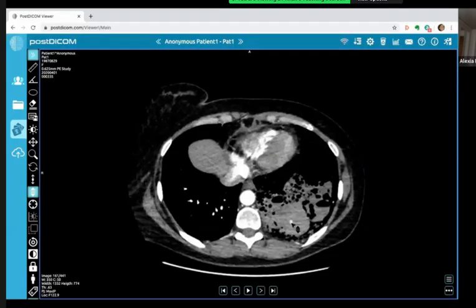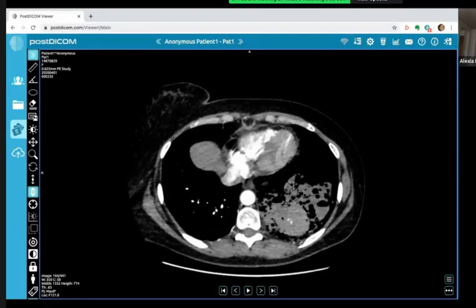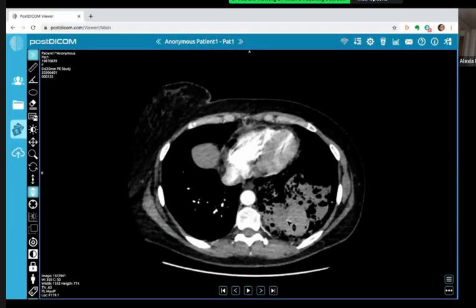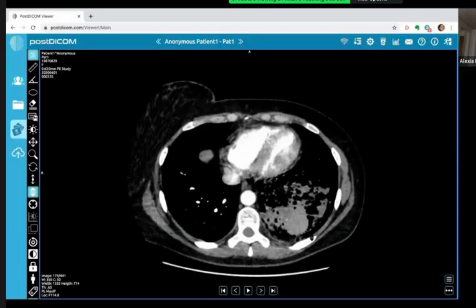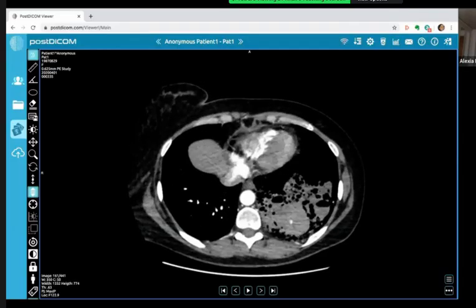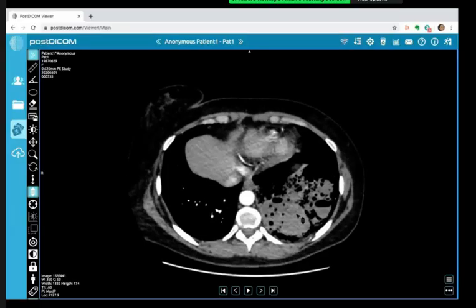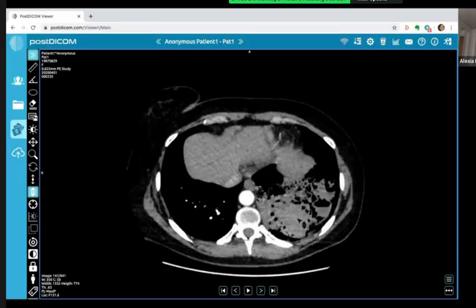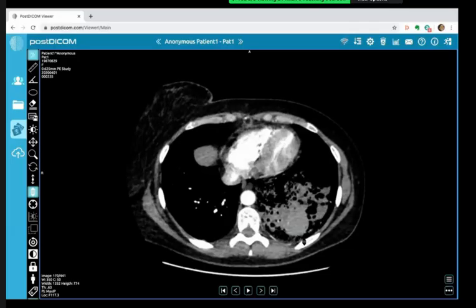Let's follow it, okay? You're talking about this, isn't it? Yeah. This structure, okay. Let's follow it. Okay, so it's here. Yeah. Okay, so I don't know whether that might represent, is that an aneurysmal vessel? Or? What about the caliber? Is it of a large caliber or? Not really, isn't it? Not really, no. It was just the configuration of it. It might have just been the way it was scrolling through.